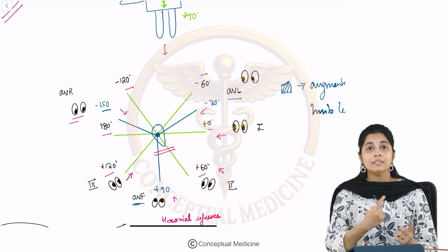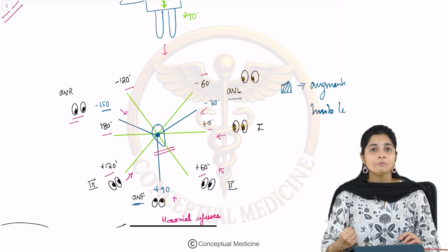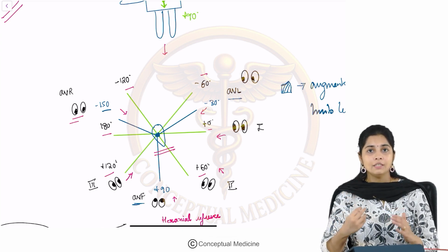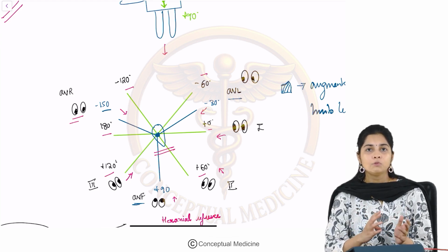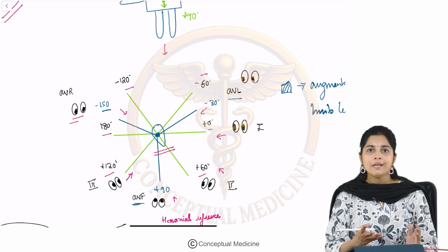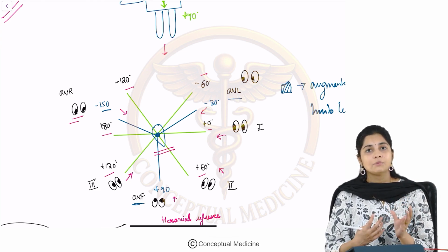Okay, so the entire heart in the frontal plane is looked upon. I would say looked upon because the direction of electrical activity in these leads will help you understand how the heart has moved or shifted, which we call the axis. Okay, so in certain pathologies, the heart can move towards the left.